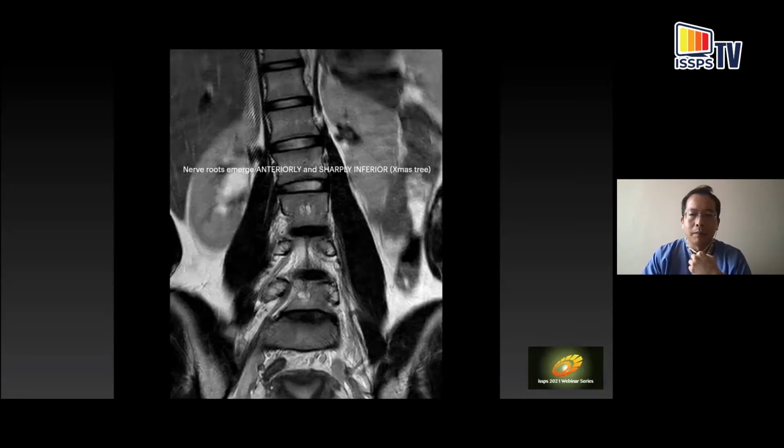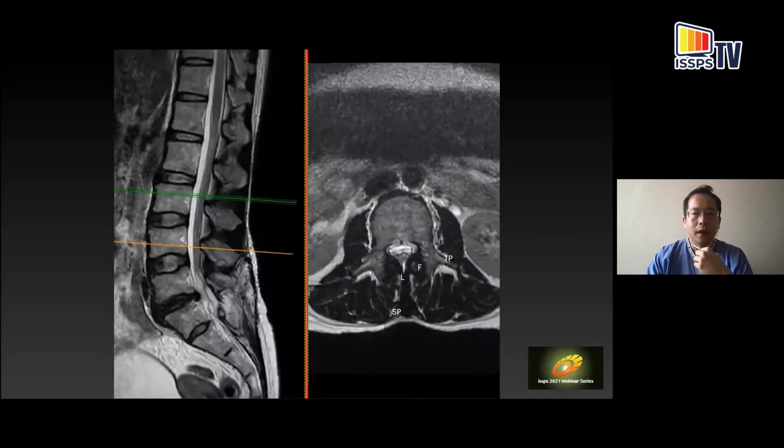And so if you put a needle beneath a pedicle here, you are in a relatively safe space compared to if you were more inferior and lateral, because then you run the risk of your needle coming into contact with the nerve root itself. Now on to the axial scan itself. Here, let me just take you through the sagittal very quickly. The supraspinous ligament, the spinous process, we're in the midline, and then that space there is subtended by the interspinous ligament. Before that, then you come through into the very tough ligamentum flavum, and then the epidural space, which usually contains fat.